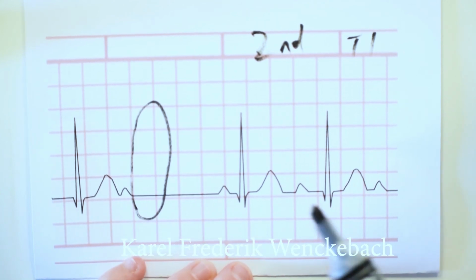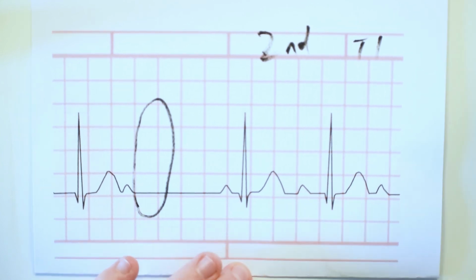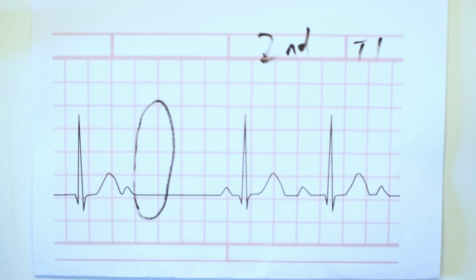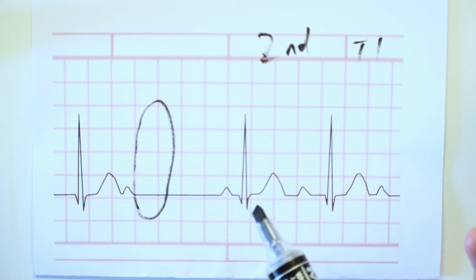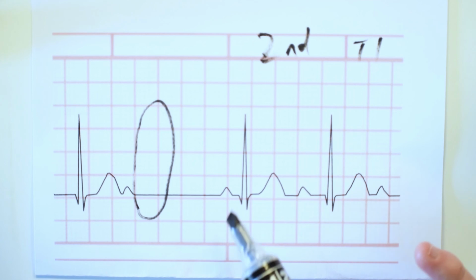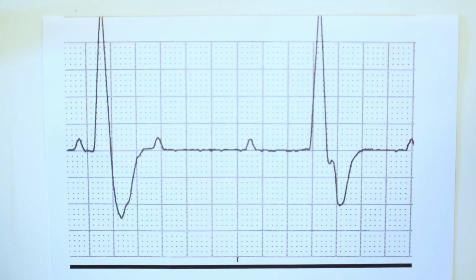So what happens is that your PQ interval increases and then drops, and it's the only ECG that does that, where you have an increasing PQ interval and then it drops a QRS and then starts again and drops. So that is quite a clear indicator, and that's also why it's important to assess if you have P waves before every QRS and QRS after every P wave, as well as your PQ interval, your QRS intervals, and all that sort of thing. That looks very slow. Once again, we can't tell rate or rhythm because we don't have enough ECG here, but you'd have to count the patient's pulse for 30 seconds and times 2, or count for 60 seconds to get an accurate rhythm, especially if it's slow.